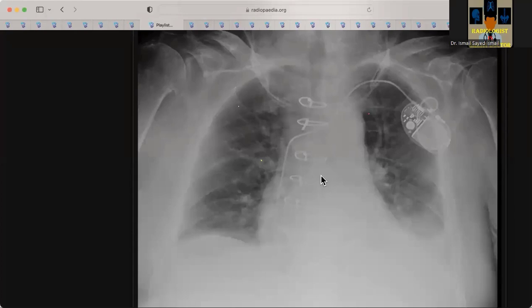I will urgently convey my findings to the referring physician and recommend proper medical treatment and further follow-up for confirmation of recovery after diuretic use and oxygen supplementation. Okay, and just have another look. What are the causes of pleural effusion? Can you see another hint that points you towards the cause of the pleural effusion here?